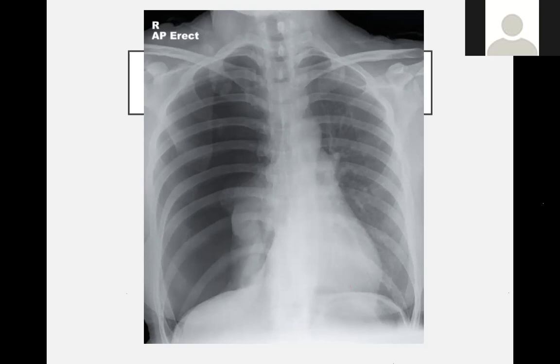Okay, so D, the costodiaphragmatic recesses on both the left side and the right side are clear. So no signs of any effusions or air under the diaphragm as well. And then looking at everything else, bones and all that, yeah, everything's normal.